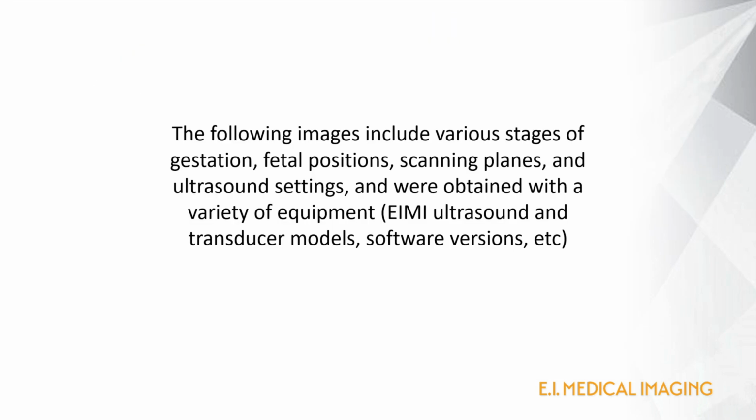The following 25 images show fetuses of varying gestational ages, positions, and scanning planes, and were obtained with a variety of different medical equipment, different models and ages of ultrasounds and transducers, with older or newer settings and software versions. Some will be simpler and prettier than others, but they all represent the type of images that you might see on various ultrasounds in the field.